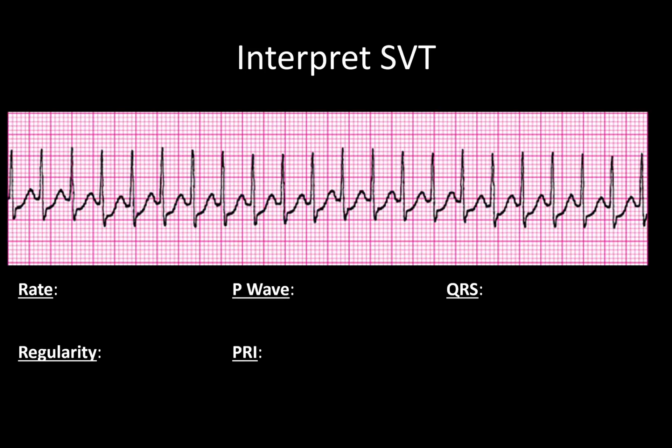Okay, here we go. So we have a 6-second strip. I'm going to go ahead and mark these out. A lot more tedious with these faster rhythms, isn't it?